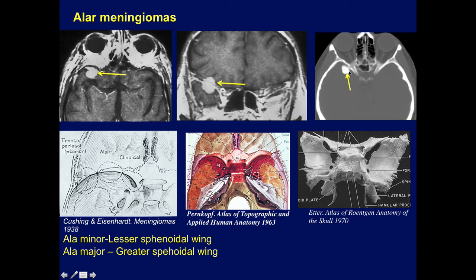These are rare lesions, and you can see it involves the middle part of the sphenoid ridge. One of the problems I'll show later, most of the sphenoid ridge meningiomas, by the time they come to be diagnosed, are quite extensive, and this distinction of 3 separate areas doesn't hold in many of the cases, if not most of the cases.